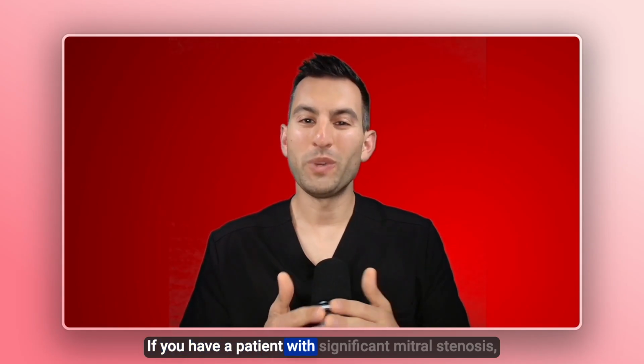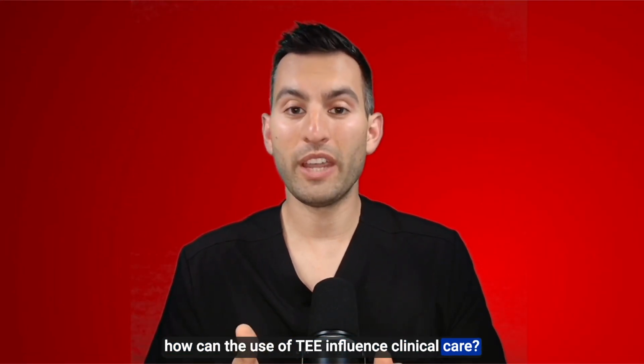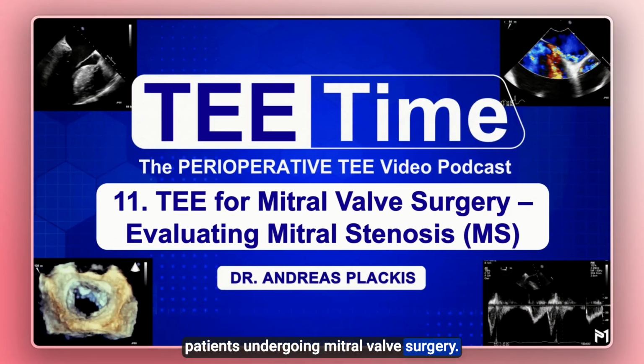If you have a patient with significant mitral stenosis, how can the use of TEE influence clinical care? Well, in this episode, we're going to cover these important considerations for patients undergoing mitral valve surgery.